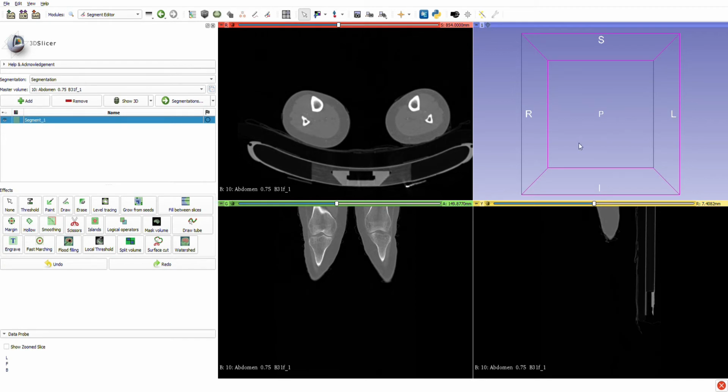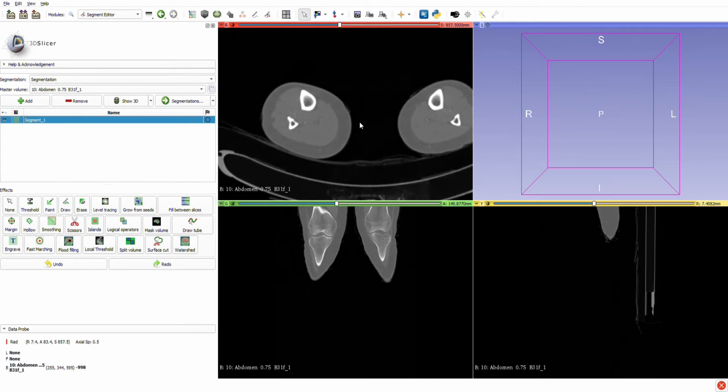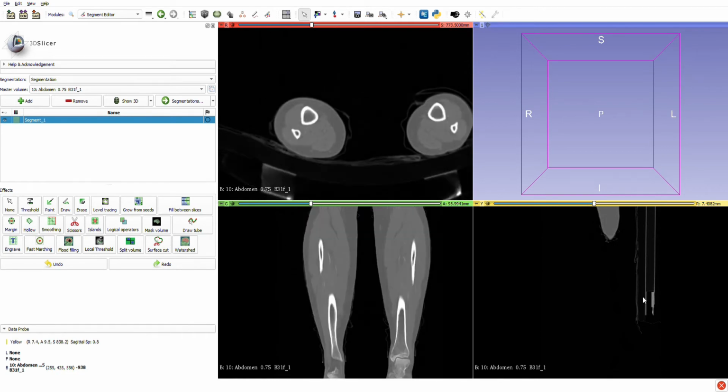I'm a radiologist at University Hospital Osijek, and this is part 2 of how to make cutting guides for mandibular reconstruction using our add-on for Blender called FFF Gen. In the first part, I described how to perform segmentation of the mandible for mandibular reconstruction. The next step is the segmentation of the fibula and peroneal artery, because the peroneal artery is necessary for the perfusion of the graft.